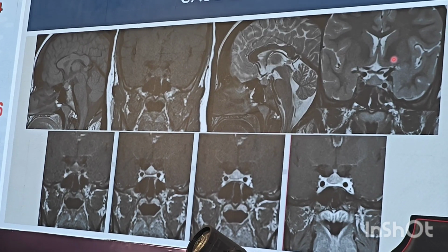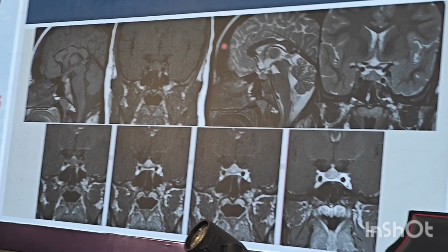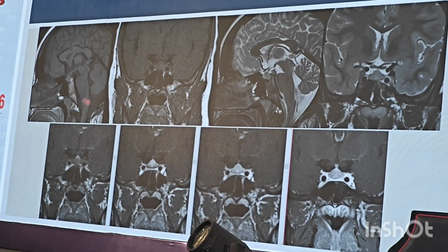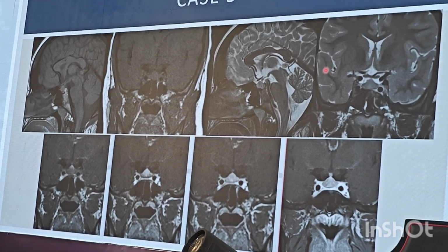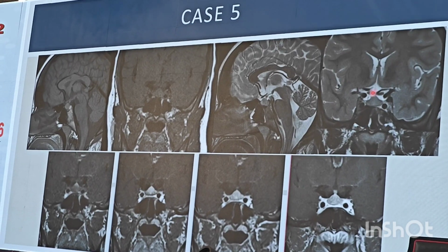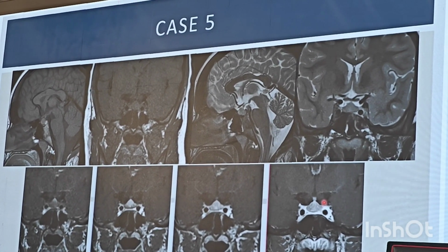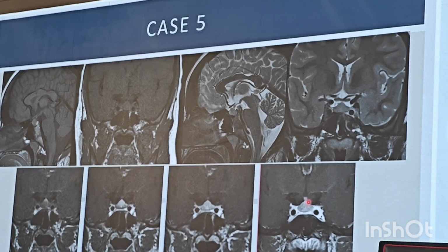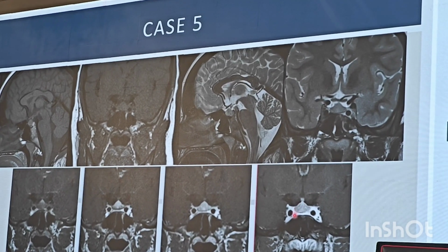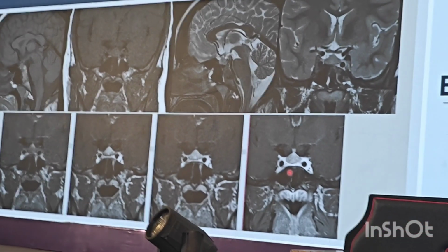I would say this is another cousin of the previous one. So again, the signal characteristics, you can see the posterior pituitary is still located in the sella. The pituitary has a convex superior configuration, right? You all agree with me. But on the post contrast, you do not see that notch which was being caused here. And the whole gland is enhancing. It doesn't have a differential enhancement like we saw in the previous case.